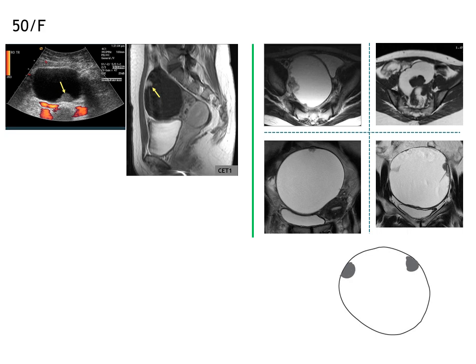Unilocular cystic mass with 1 or 2 mural nodules, and an important point is that the surface of these mural nodules is quite smooth. This pattern is quite characteristic of clear cell carcinoma of the ovary that belongs to epithelial tumor category.